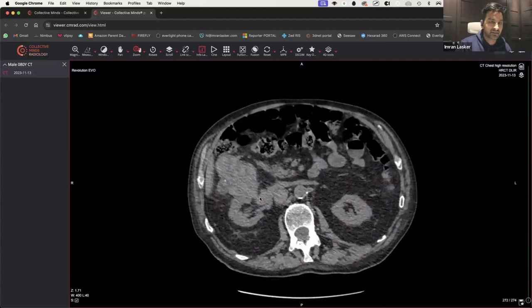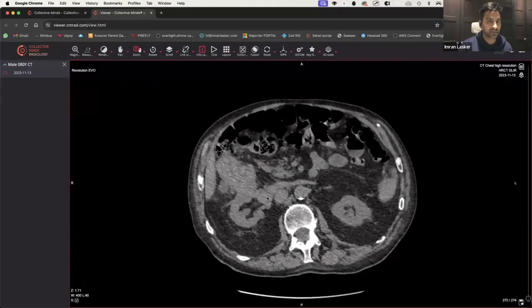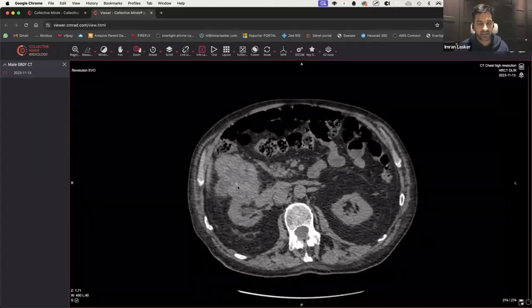So one thing someone said is that the renal vein looks slightly distended. And that's actually one of the things that can happen with an RCC, that you get extension of the renal cell cancer into the renal vein. So that's entirely possible, but I would be hesitant. I may mention it, but at the end of the day, there's no point in trying to be too much of a hero. You see the RCC, you're worried about pulmonary metastases, and you're going to end up getting a contrast study for full staging, right? You're going to do the abdomen-pelvis and CT head as well, just to make sure there's no intracranial metastases.